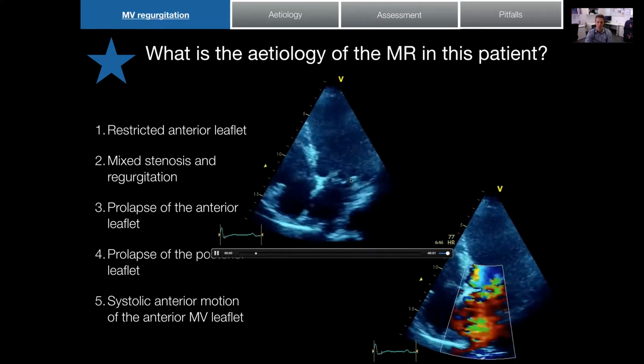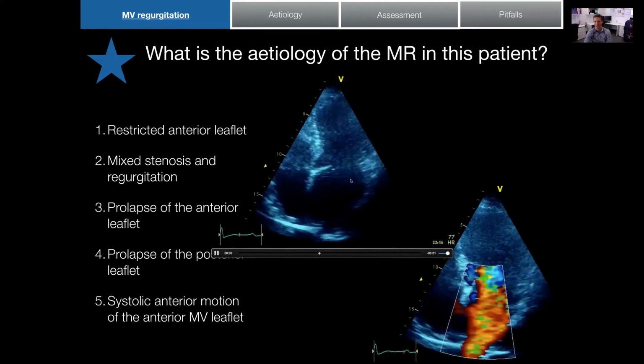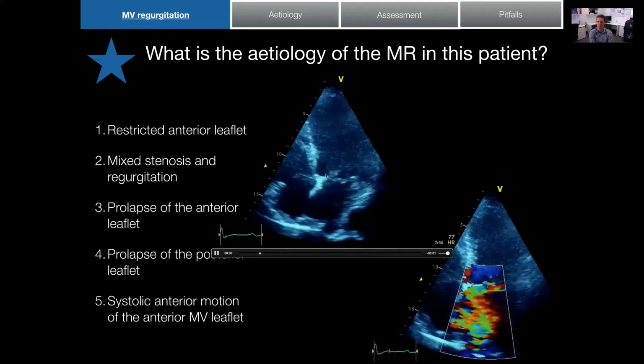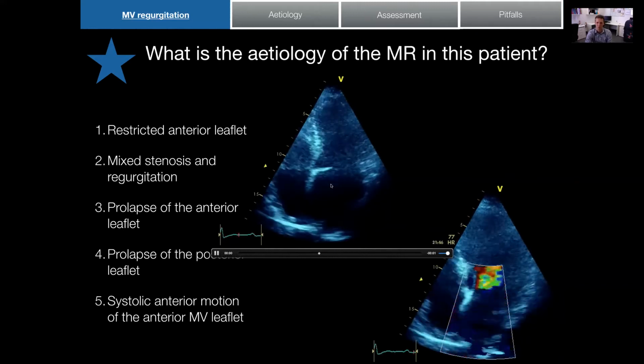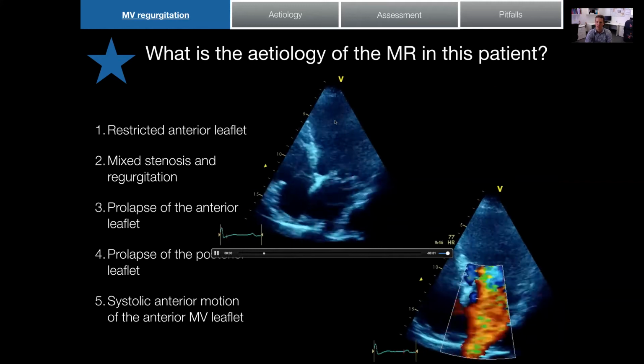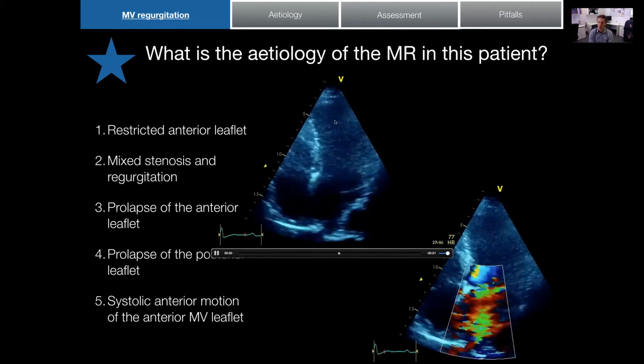I know the one next door to the septum is the one that's closest to the aortic valve. The aortic valve's at the anterior section, so that's how I know that that's the anterior valve. But I've still got the posterior mitral valve leaflet tip that's sort of pointing towards the left ventricle. It's not pointing down to the left atrium yet, so that means it's a prolapse.